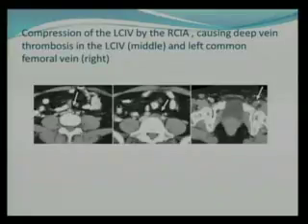So here you can tell that this is the artery, because it is very round, if I were to take a compass and draw it, I would be able to. However, look at this sausage-shaped structure, very oblong, oval structure. This is the vein. And this is the vein that is really being affected here, which we hardly see. This is the left common iliac vein that is being compressed by the right common iliac artery.